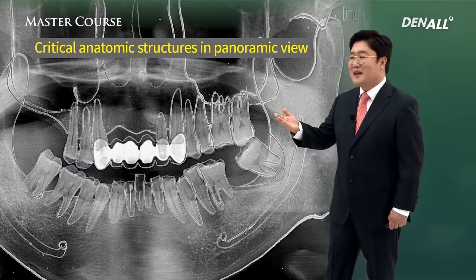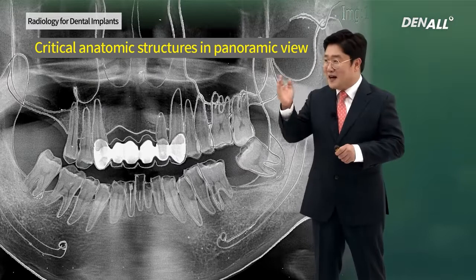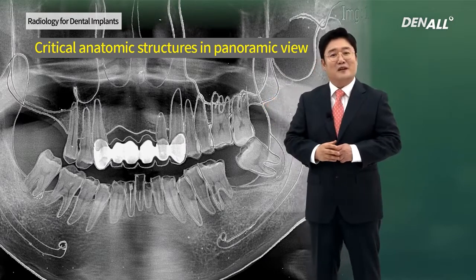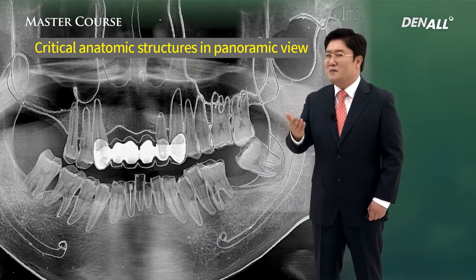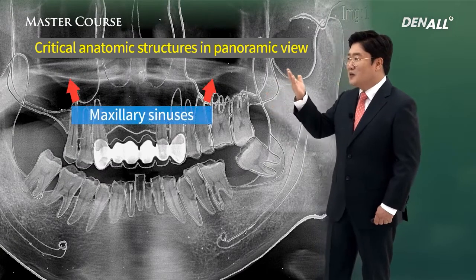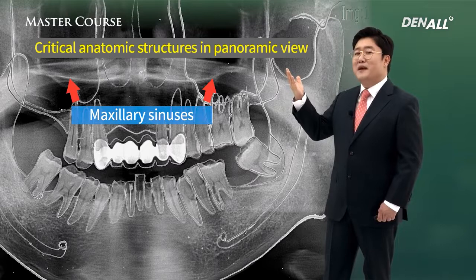This was an implant patient. On the panoramic view, transparent paper was laid with a sharp pencil. The pictures were drawn. What was it called? Tracing. Through the tracing on the panorama pictures, we identify the important things. First, maxillary sinuses, the location, borders, and the condition of the sinuses were identified.